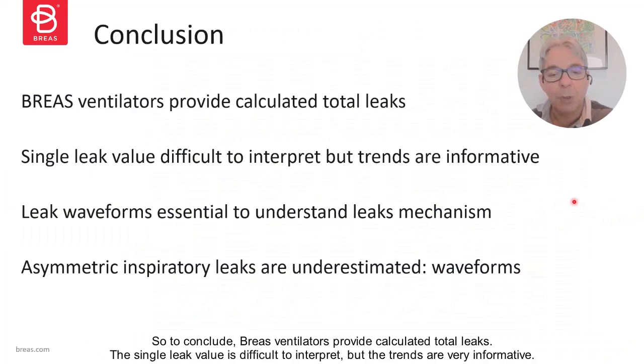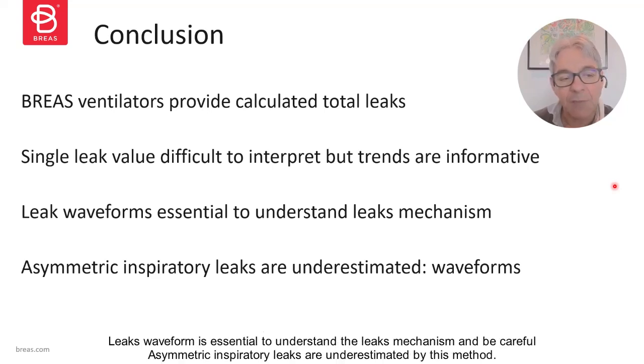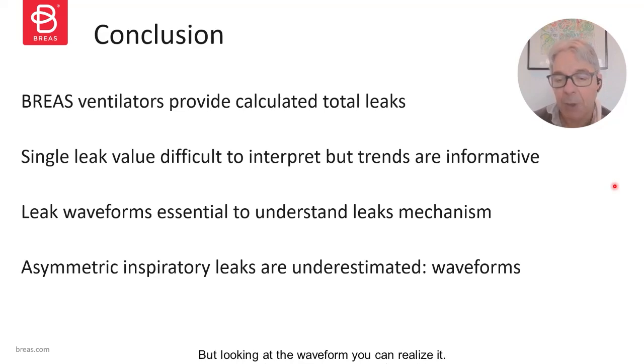So to conclude, ventilators provide calculated total leaks. The single leak value is difficult to interpret, but the trends are very informative. Leaks waveform is essential to understand the leaks mechanism, and be careful, asymmetric inspiratory leaks are underestimated by this method, but looking at the waveform, you can realize it. I thank you for your attention.